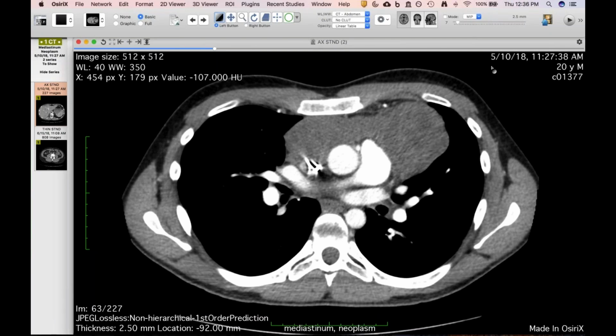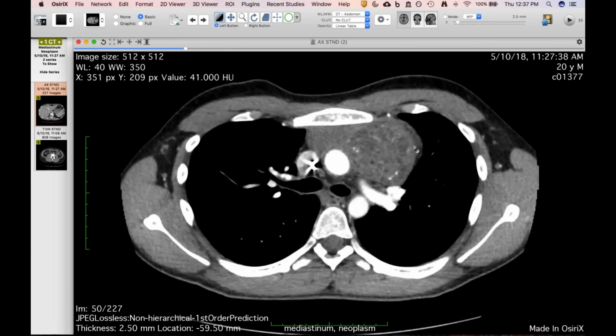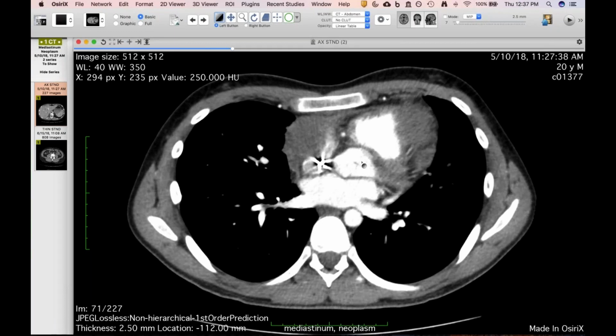Well, it's actually funny you said that, because about 2 hours ago, he got a restaging study, which I haven't had the chance to load yet. But this part has decreased, the lung nodules have decreased, and then this thing is entirely unchanged with the fat and the calcium. So, yeah.